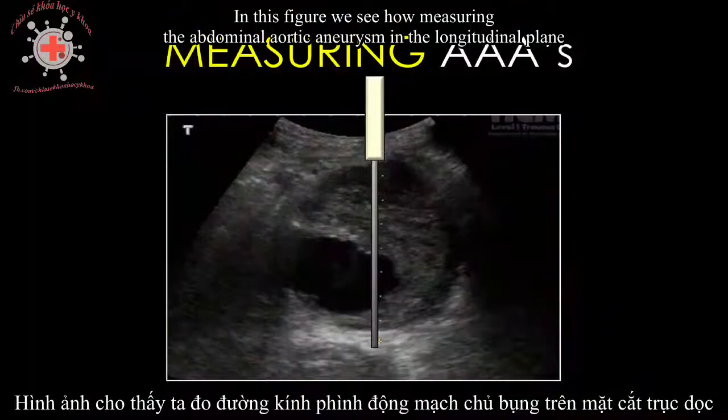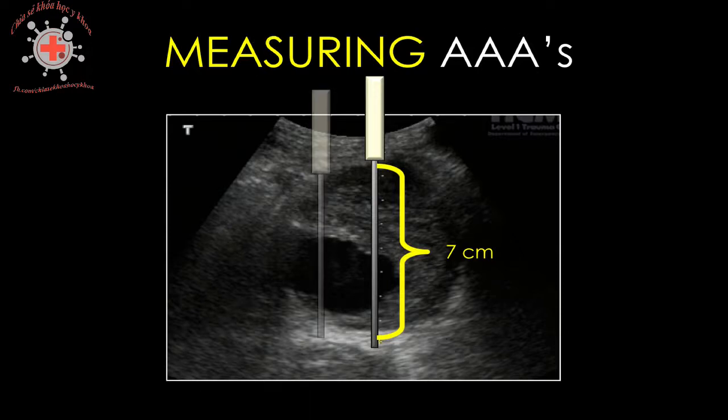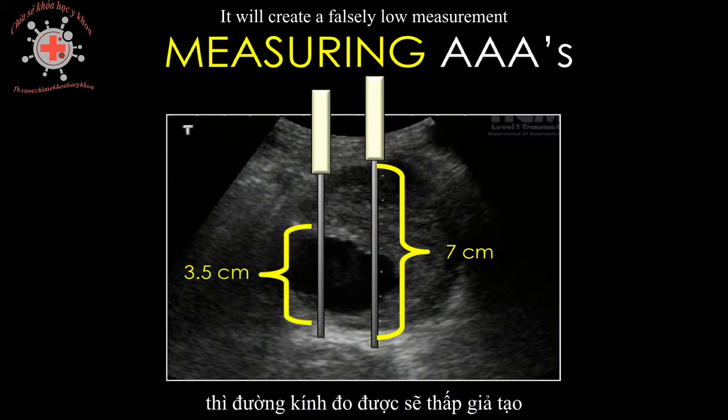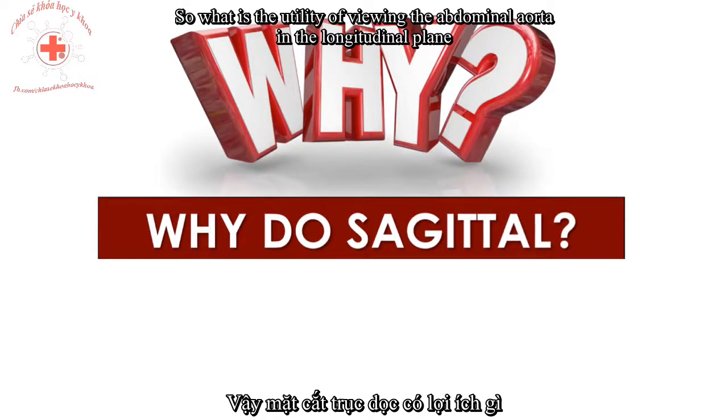In this figure, we see how measuring the abdominal aortic aneurysm in the longitudinal plane may be accurate if the ultrasound signal is at the center of the aneurysm. But if the signal is not directly centered, or if angled away from the anterior-posterior plane, it will create a falsely low measurement. So what is the utility of viewing the abdominal aorta in the longitudinal plane?